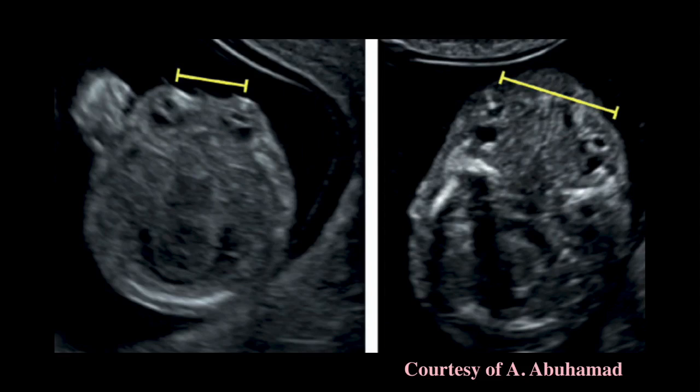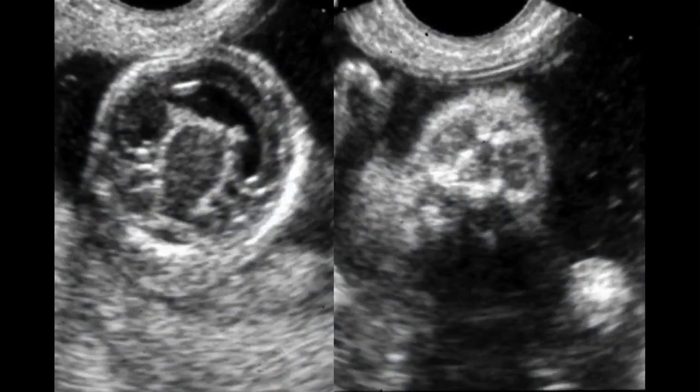I like to look. And I guess the reason why measuring doesn't help me is because if it looks normal, if it measures abnormal, I'm still going to end up calling it normal. And if it looks abnormal and it measures normal, I'm still going to wonder. So I'm going to end up questioning it anyway. So I rely on my own ability to see if something looks normal or not, which we all have.